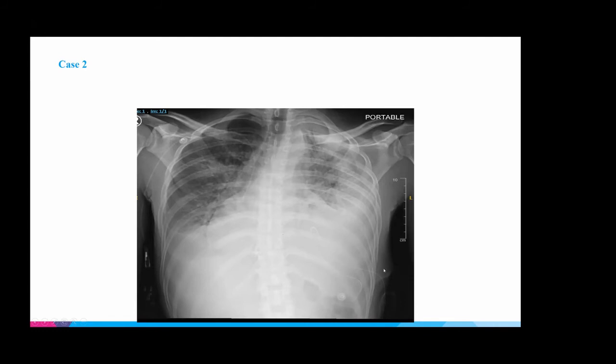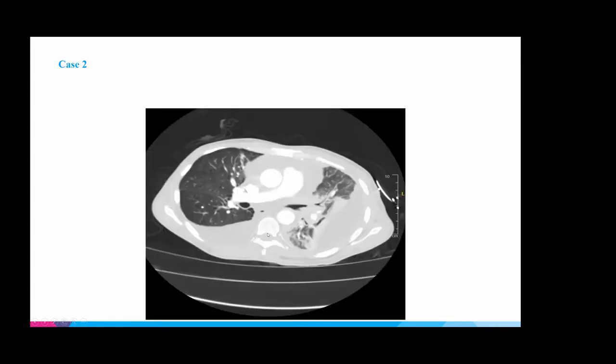And then this is just a snapshot of his CAT scan showing the right effusion, which we saw on the ultrasound. Small, more simple appearing compared to the left, which is very loculated. Normally if the patient's lying flat, it should be gravity dependent. So the fact that it's just hanging out on the lateral aspect signifies that it's loculated, and when it's loculated, that's something that would probably require a chest tube to help drain. And so this patient ended up getting the IPC removed, a new chest tube placed with lytics only. He wasn't a good candidate for VATS. That's why they elected to do chest tube alone instead of VATS.